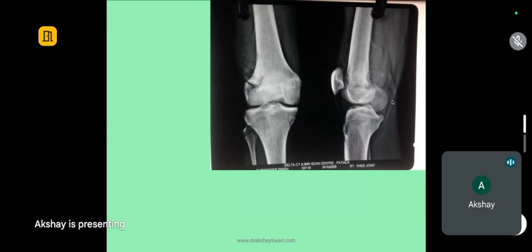Again, Avneet, you want to try this? It's skeletally immature, sir. Okay, or maybe adolescent, just about to mature. I agree. Skeletally immature, fine.